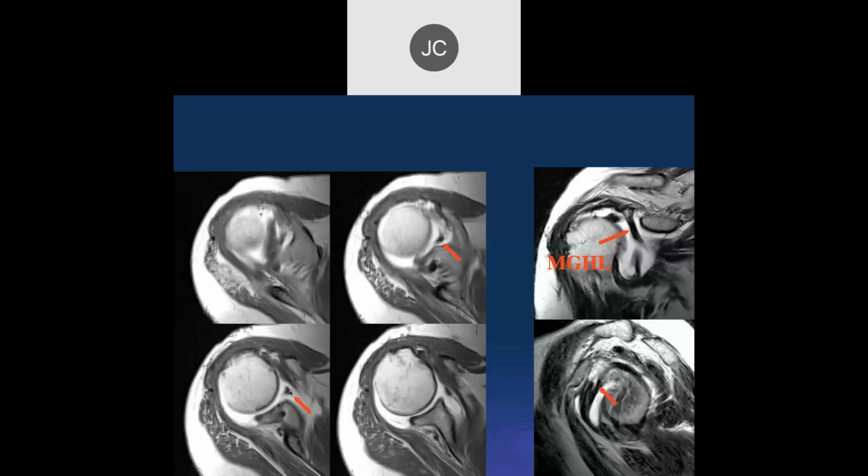And if you notice here, if you follow this down, this is the middle glenohumeral ligament, which means there's no anterior superior labrum here, right? One thing to remember also is, John, I'm sorry to interrupt, these ligaments are actually capsular. They're also called anterior capsular ligaments. So they're basically fused with a capsule, and so that can be thick or it can be thin.